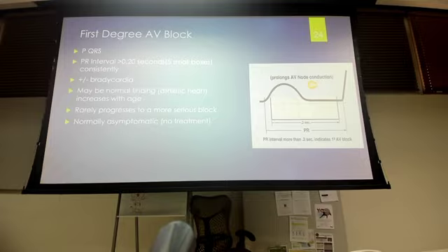Consistently, I've got a P QRST. My PR is 0.225. I've got a P QRST. My PR interval is 0.25. Consistently, every time, every beat you look at, it looks good, except the PR interval is always long, and it's the same. When you measure it out, it's going to measure out the same here, same here, same here. It's just longer than normal.